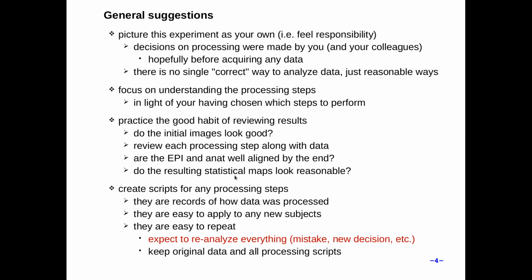Do the resulting statistical maps make sense? There will be a lot of quality control output that can be viewed to help make these choices. But for at least some of the subjects, a few of the subjects up front, you should look at them in detail. And then later on, maybe you can focus more on the HTML quality control report that's produced at the end.